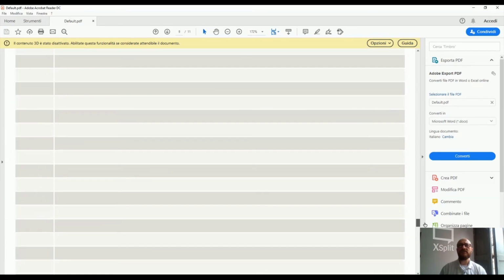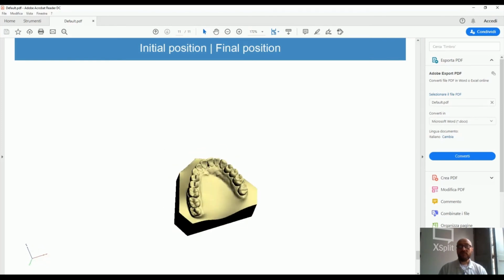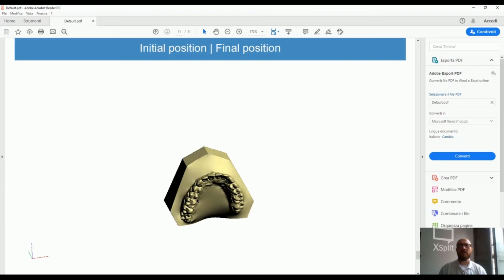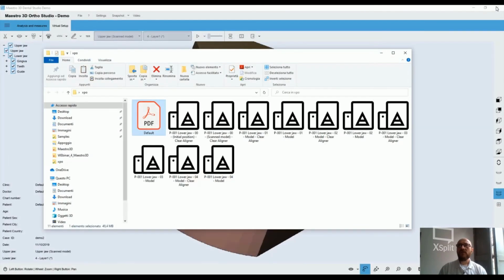At the end, I also have the possibility to see, I have to enable it to see the 3D model. Not just one, I have different 3D models, and these are 3D models inside the PDF report. So it's perfect for sharing, as I told you, details and analysis you have performed with the different stakeholders. And that's it.